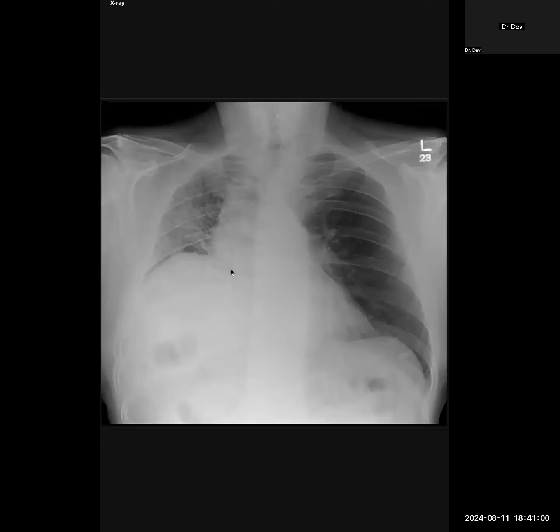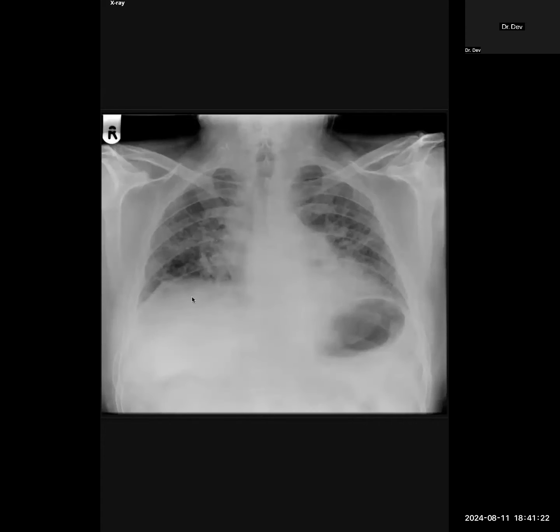Finally, did we go to this one? Yes, it can be a case of lymphangitis carcinomatosis, but if you had more time, we could have explored the fact that with a completely normal left lung and this kind of right lung, you have to consider the possibility that it can be a transplanted lung on the left. If I were to show you the previous image of this patient, this was how their lungs looked.